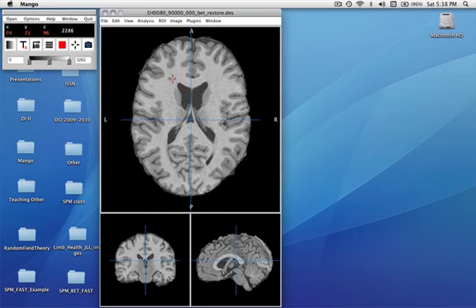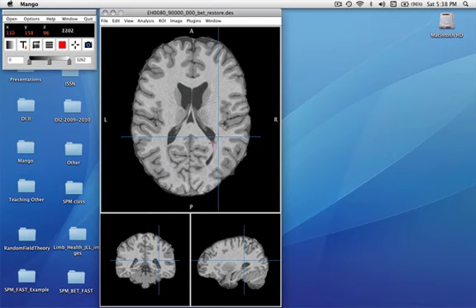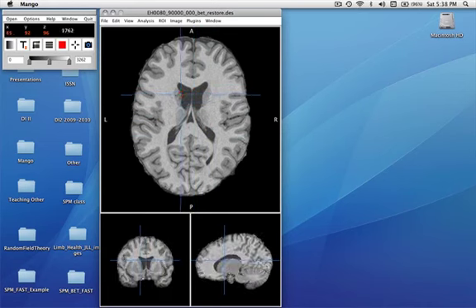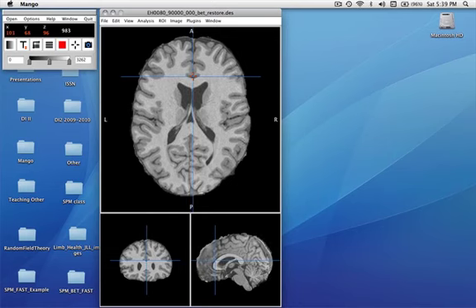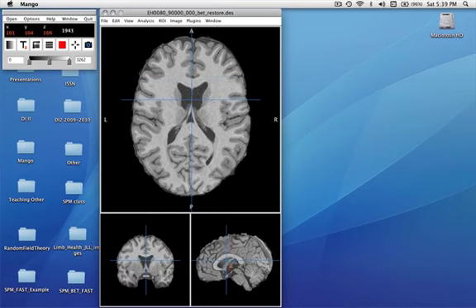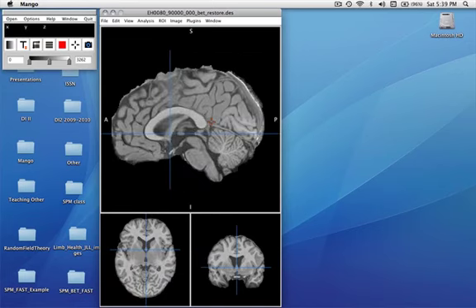We also have crosshairs that we can anchor, and the crosshairs tell us where the three views are intersecting. If you press and drag the mouse, you can simultaneously move them around to inspect the image. This turns out to be fairly nice sometimes if you want to move to a particular place, and you can navigate down in the smaller images as well. The image at the top is the image of focus for doing processing, and if it doesn't happen to be the axial, you can switch to which view you want by just hitting the space bar, and it toggles that.